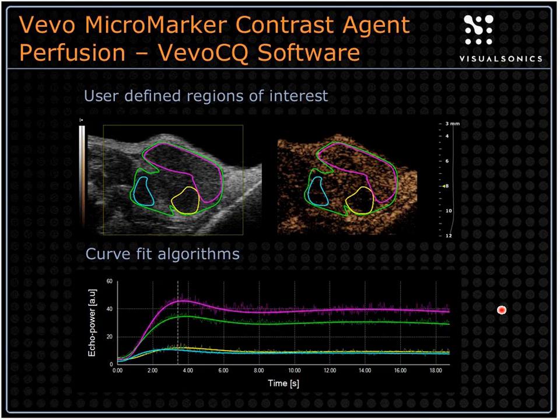If a clip is too short, say 5, 10, 15 seconds, there may not be enough time, depending on the tissue that you're looking at, for the level of signal to come up to that constant peak level before tailing off. So some of those parts of the modeling algorithms don't really apply. So the software will complain. It'll say you should have something longer.